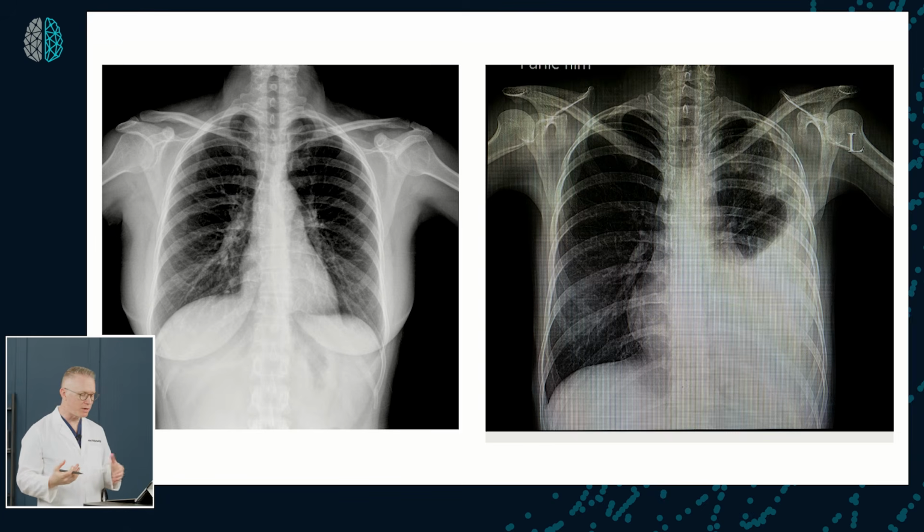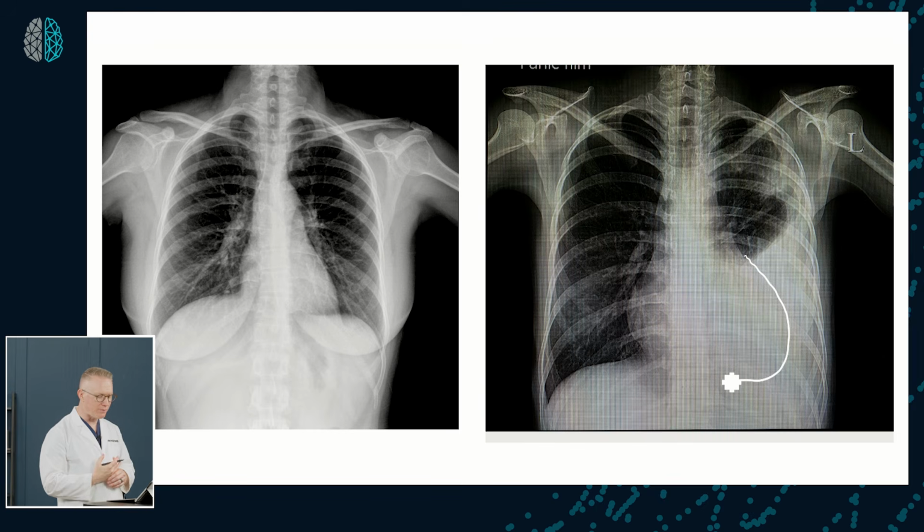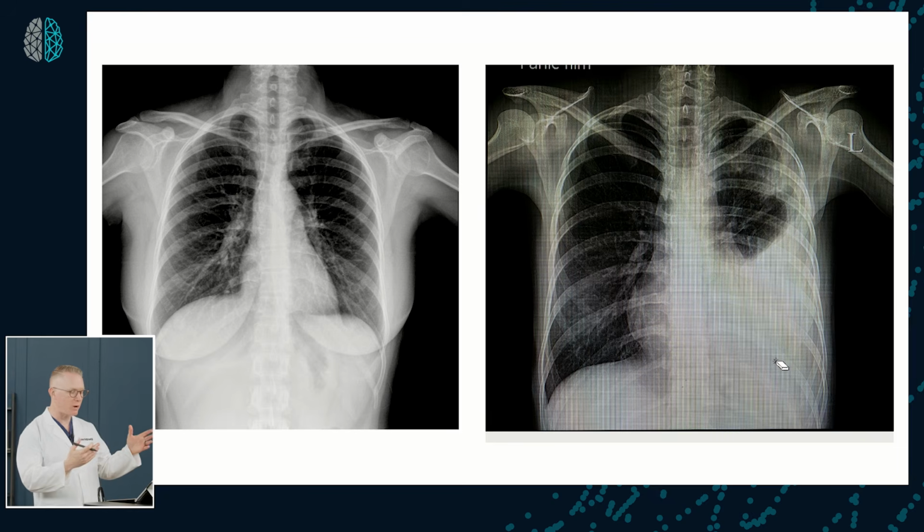This is a patient with a pretty significant fluid accumulation, so pulmonary edema, effusion, again distorting the cardiac silhouette, mainly that left ventricle and the apex. I don't know where it's at. I drew that line there, but I can't really say for a fact that that's what it was, but that's just kind of where it was supposed to be, right?